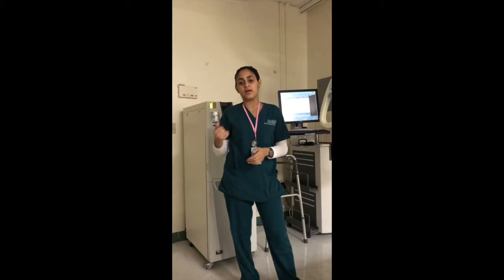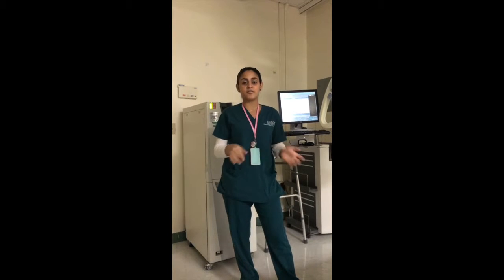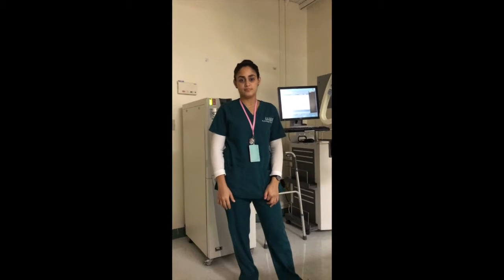I'll be presenting today about the different positions in order to get C-spine x-rays. Later on, I will be explaining different positions, different factors, everything that you will need in order to place the patient in the right position to get the right x-ray image. I'll be explaining everything about the cervical spine.